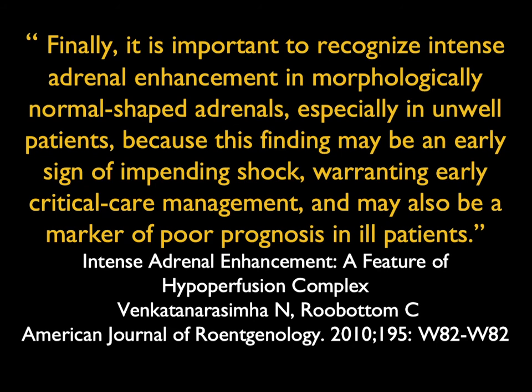Now, sometimes you can say, do I use a measurement? The answer is really no. When you see bright adrenals, you know they're bright adrenals. And so really what it is, normal shape, normal size, but they're very bright on the imaging, and that brightness would persist between arterial and venous and really in delayed phases. So it's a very good finding. You're not going to see it that frequently, but it can be very critical the times you do see it.